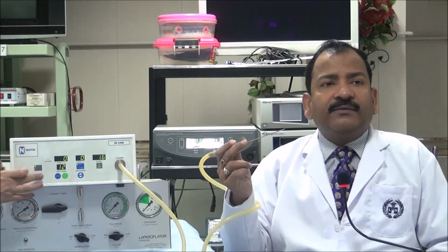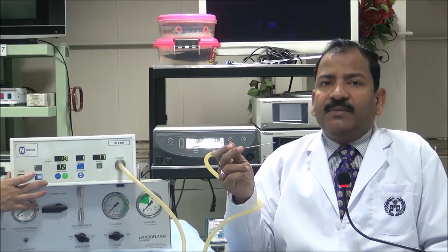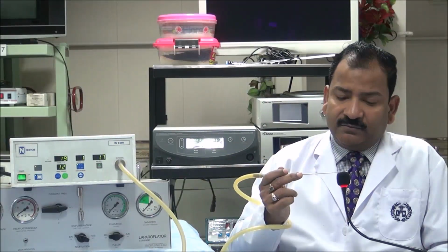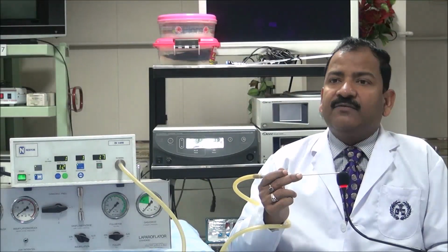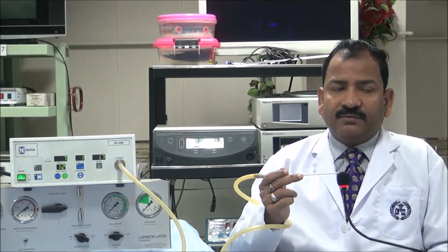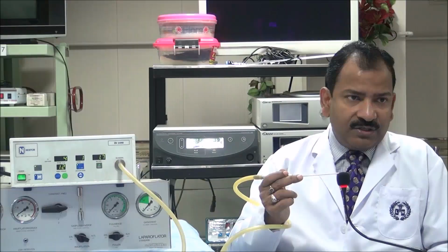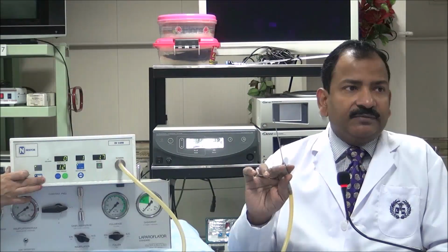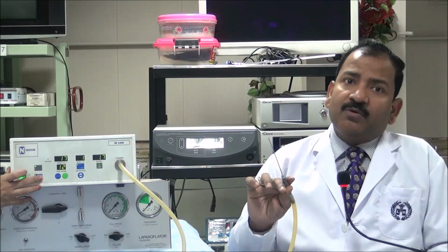Once you start the Veress needle mode, it will become pulsatile. This is pulsatile flow. Now listen to this. It's not continuous. Veress needle mode is always pulsatile mode, and it is the preferred mode.